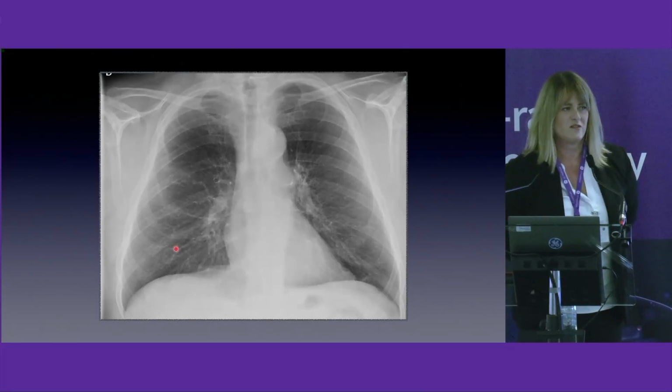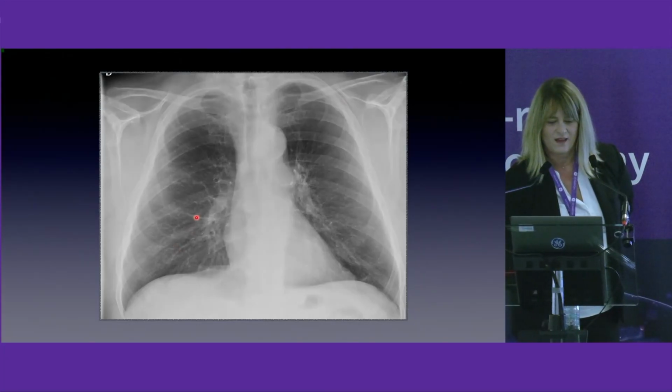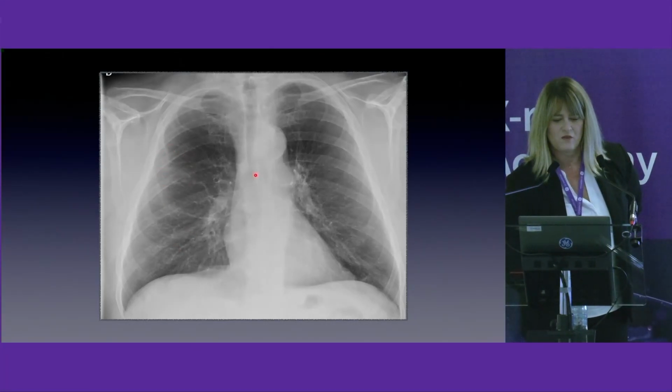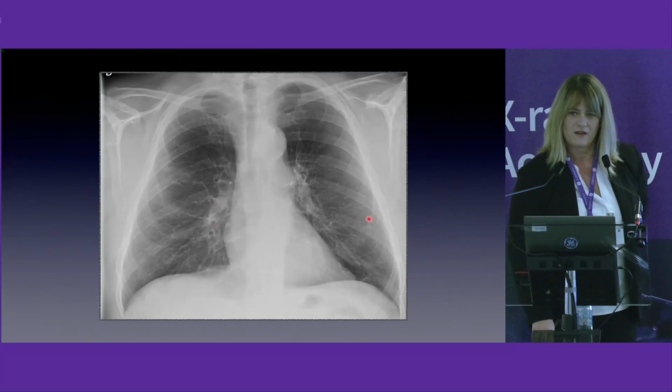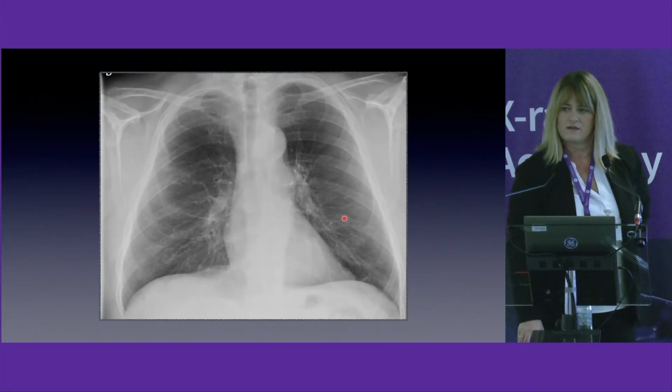So my attention was here. Just compare the right to the left portion, the middle area of the lung. Do you think that this one is the same opacity, the same transparency, or is there anything different here?